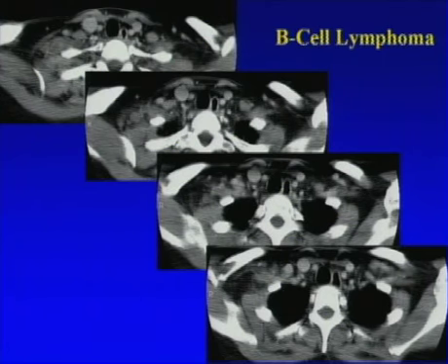This is a patient with B-cell lymphoma who didn't want to get an MR, and so we evaluated her on CT. And if we look at the supraclavicular fossa, we can see that there are some ill-defined soft tissue, much more nodal masses, and again, these ill-defined areas as compared to the contralateral supraclavicular region, and this was from B-cell lymphoma involving the brachial plexus.